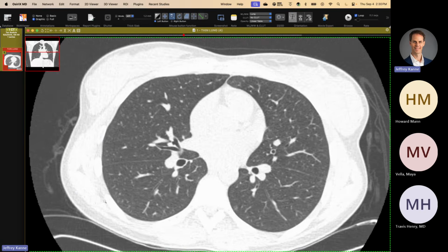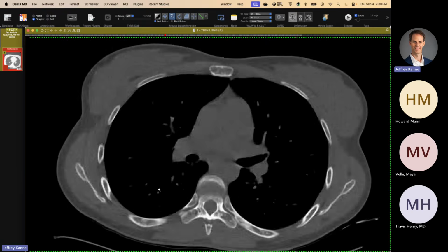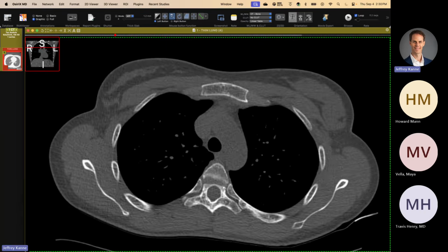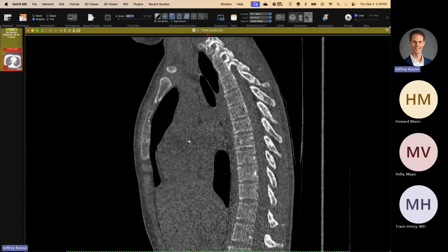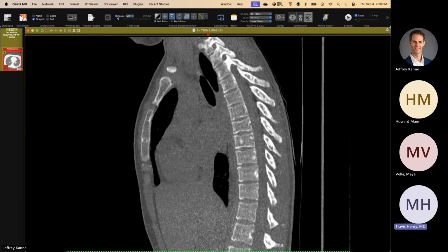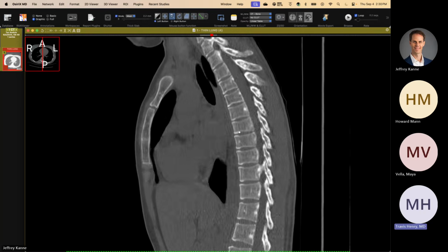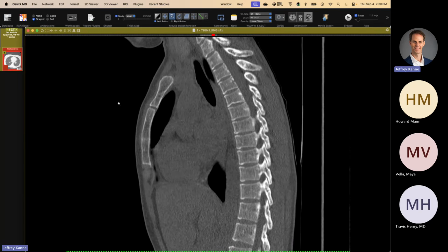She's like 20-something. So the clue is, if you look at the bones, and I'm going to get this window right one of these days, there are all of these little sclerotic foci in her bones. I'll do a sagittal of the spine. You can see them better. I'll thicken this up a bit. Come on. Nice. Yeah. So any ideas, guys? Yeah. MMPH? Yep. Yep. Good. Yeah.